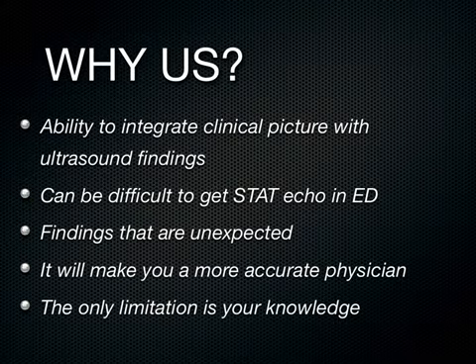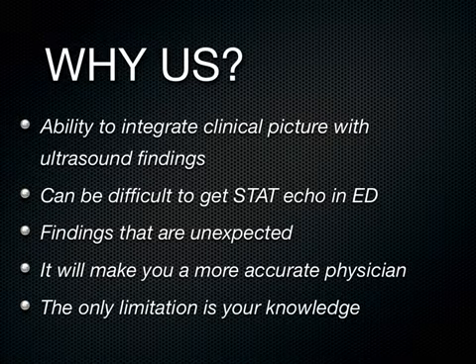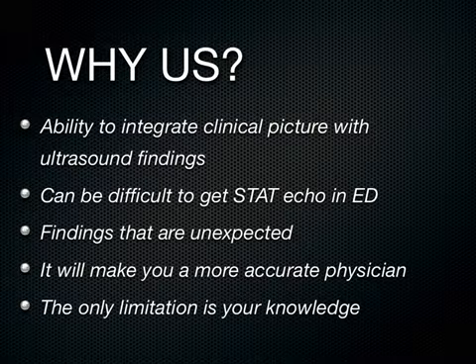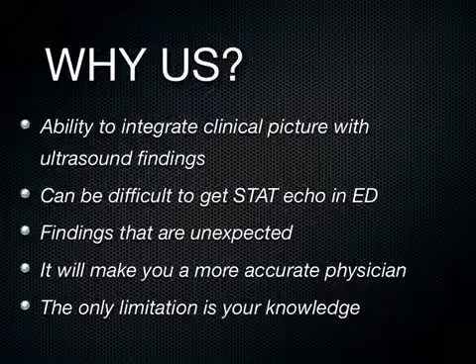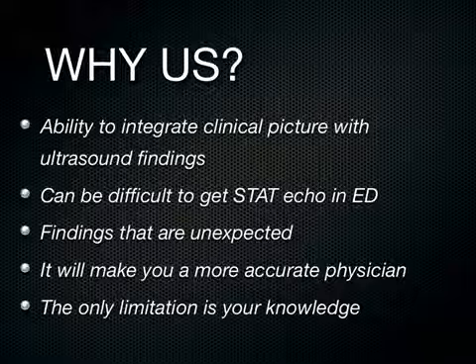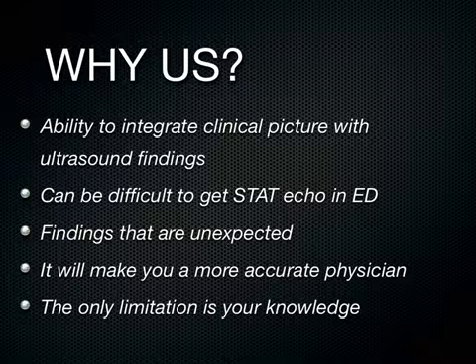We had a case of this just recently, 2 days ago, in a patient who came in with fatigue. I just reviewed it today during QA. The students were looking at the gallbladder and other structures, and there's a great ultrasound image of them looking at the gallbladder, but off in the distance towards the bottom of the screen, you can see a big fluid collection with the heart beating in it. Then they focused on the heart, and this was pericardial tamponade, and the patient went to the cath lab and had a pericardiocentesis done as a cure to their fatigue.